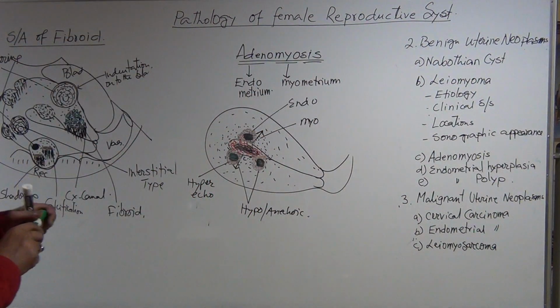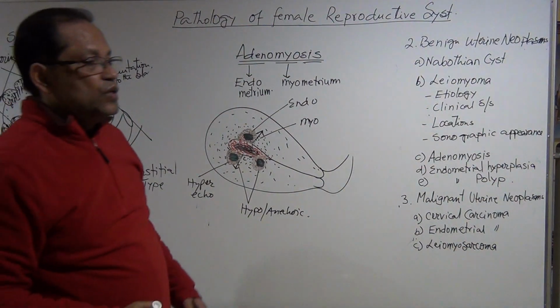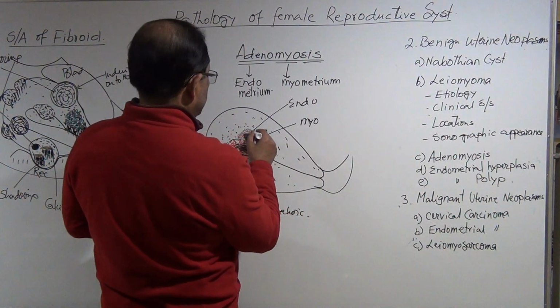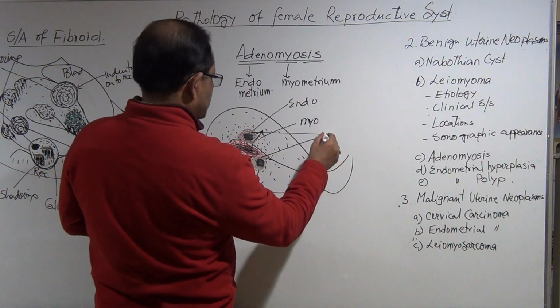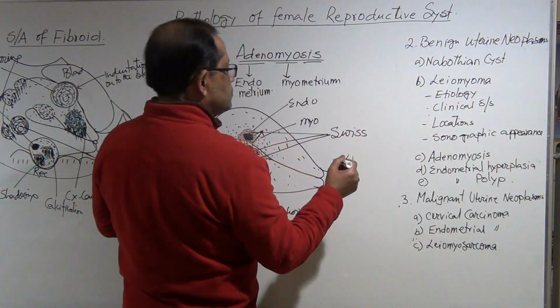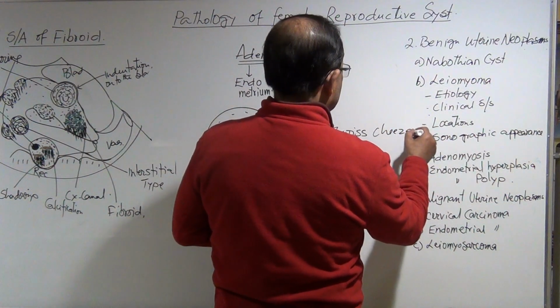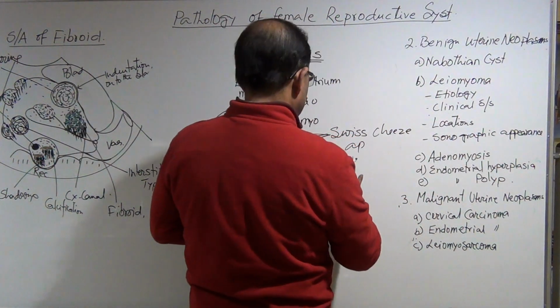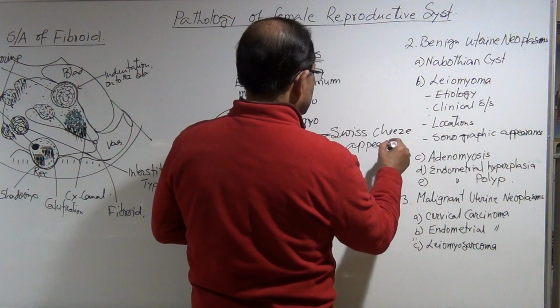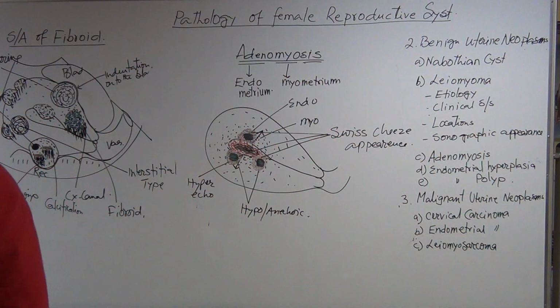Okay, and as a result, sonographically we call it Swiss cheese appearance.